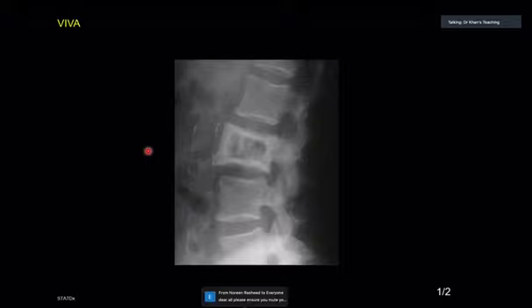What happens is that, first of all, the vertebral body is enlarged. Enlargement of the vertebral body is not a very specific finding. Other things can also enlarge a vertebra. But then there is coarse trabecular pattern. You're not very sure. But picture frame is something which does not happen in any other entity.